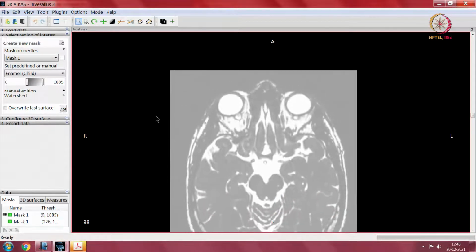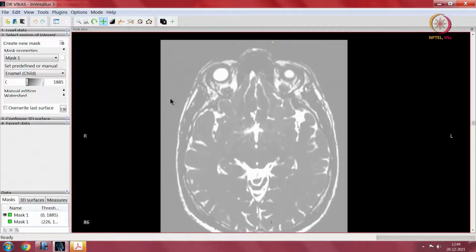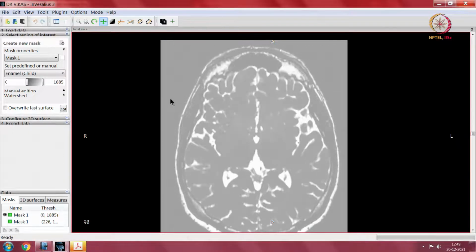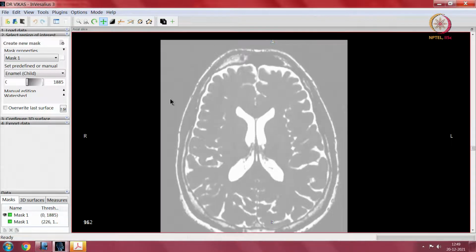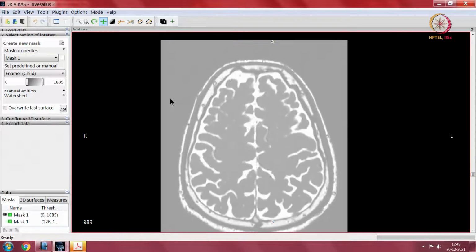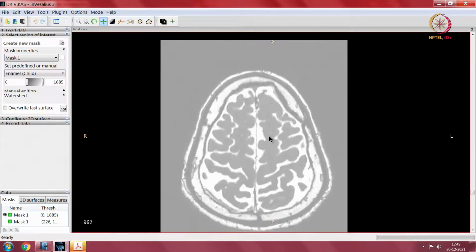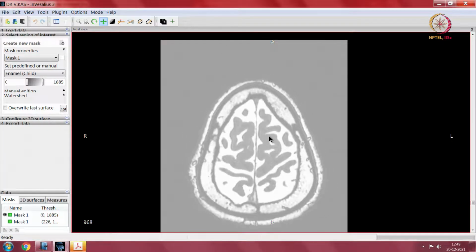description. Axial section. So, we can scroll above and below to find out. So, I am going above. How do I know that I am going above? Because I am still seeing cerebrum and I am not seeing brainstem. If I am going down, I should be seeing brainstem.